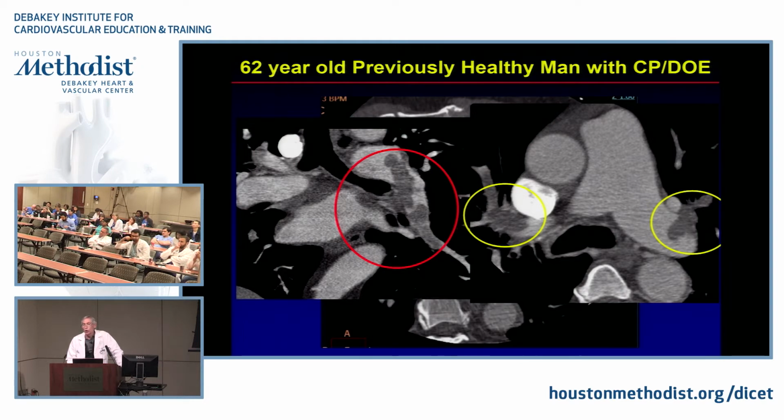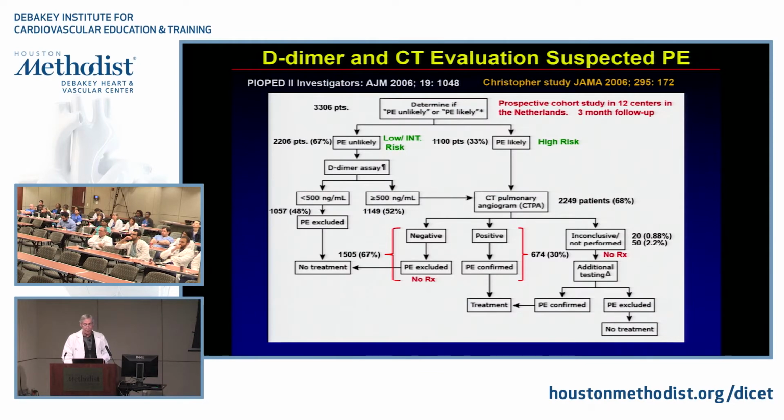And so, when you read studies, you should always be open to everything, right? You shouldn't just say, oh, no perfusion defect, done, finished, poof, okay? You should look at everything and evaluate everything. And when things don't make sense, ask why it is like that. You should really investigate further and give that information to the physician who ordered the study, okay? So this guy had large bilateral pulmonary emboli. Incidentally, pulmonary emboli are very well seen with CT.